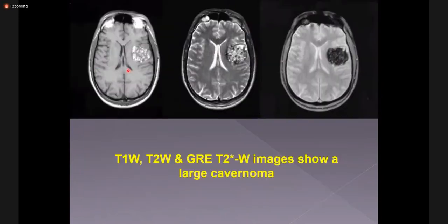This is the T1 weighted image. This is the T2 weighted image. On T1, CSF is dark; on T2, CSF is white, with an overall gray appearance. And the lesion is hyperintense with a popcorn appearance on the T1, and also heterogeneously hyperintense on the T2 with some flow void areas, but it should drop out of signal in the gradient echo.